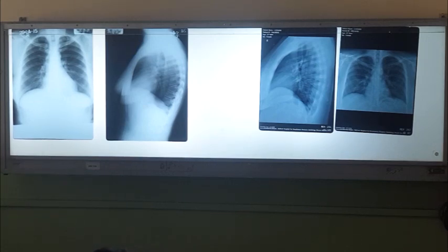Other thing is the X-ray exposure, right? Just remember, your intervertebral discs should be barely visible through the cardiac shadow if the exposure is good. Intervertebral discs should be barely visible through the cardiac shadow. If you can see the whole spine, then that is overexposed, so everything will be dark. And then you can easily miss a pneumothorax.